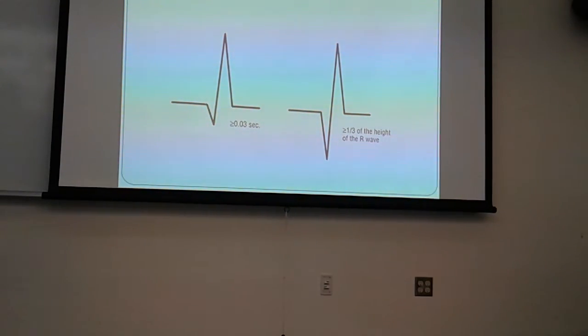Between this EKG and the next EKG you took, you might have had those formations of those QRS complexes. In which case, you now know how old that death is because you've been doing serial EKGs. But if we were to pull that one EKG that showed the Q wave out of the mix and hand it to somebody, they could not tell you when it happened. You'd have to have the rest of the case to determine when it happened.